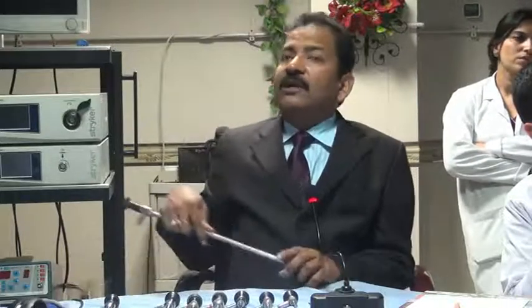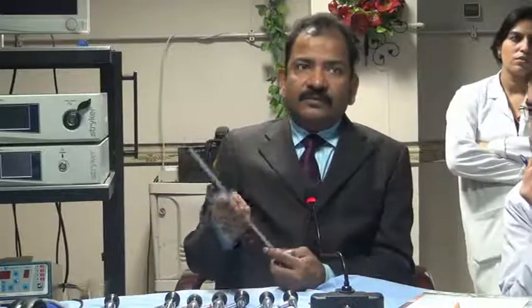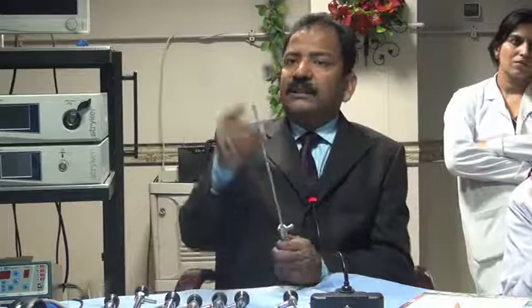And optical axis. The optical axis is the angle between the longitudinal axis and the center of the field of vision. So, 12 mm telescope ले आएगा मशीन को. If you see here, this is a 10 mm telescope.